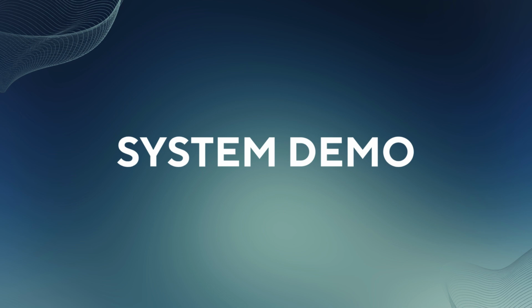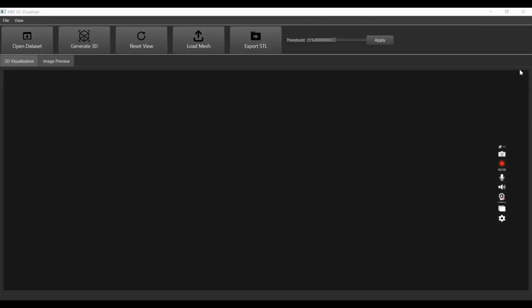Next is the system demo. Here you can see the interface of the application. So we have open dataset, generate 3D, reset view, load mesh, and also export STL function. You also have two different tabs, which is image preview and also 3D visualization.